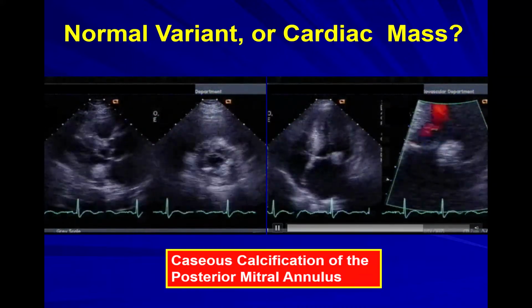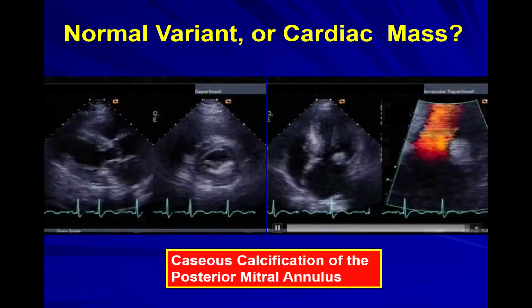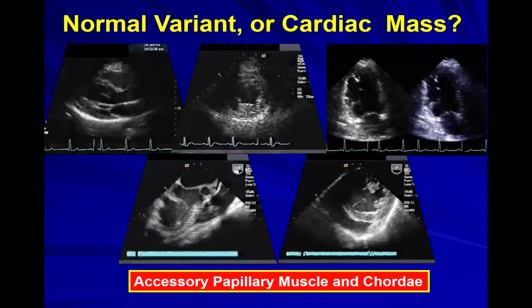I've seen all of it. It's a form of MAC, but the inside is very liquidy, so it's very difficult for the surgeon to remove this, and honestly, there really is no reason to remove it, just to recognize what it is.